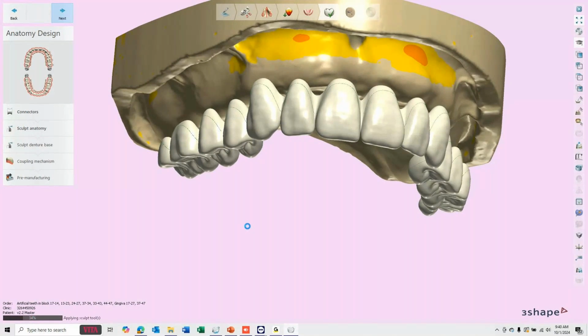So after we get done with this, we'll talk a little bit about some manufacturing options and then how to finish these dentures. So we'll go through that, and I'll do some demos under the overhead camera so you guys can see what it all looks like and see what some of the options are. We'll just finish up this software piece and then we will jump on to that.